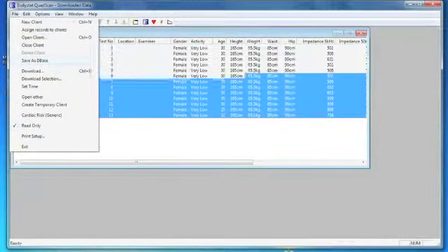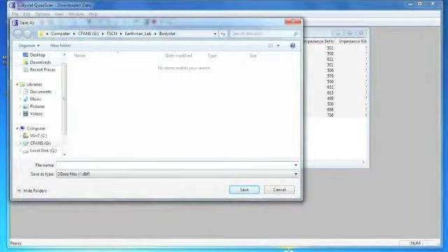Now, what I want you to do is each week, I'm going to want you to put your site in and then the date of download. So let's say we're talking about the University of Minnesota Fairview. I would just say Fairview, and I'm going to hit an underscore, May 29th, 2013. So I've got the date of the download and the site clearly delineated in the Excel file.